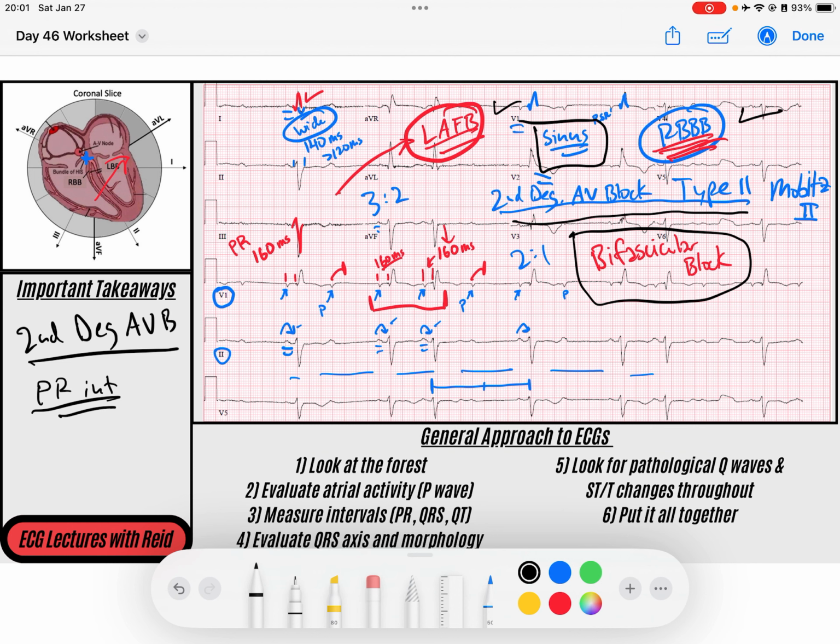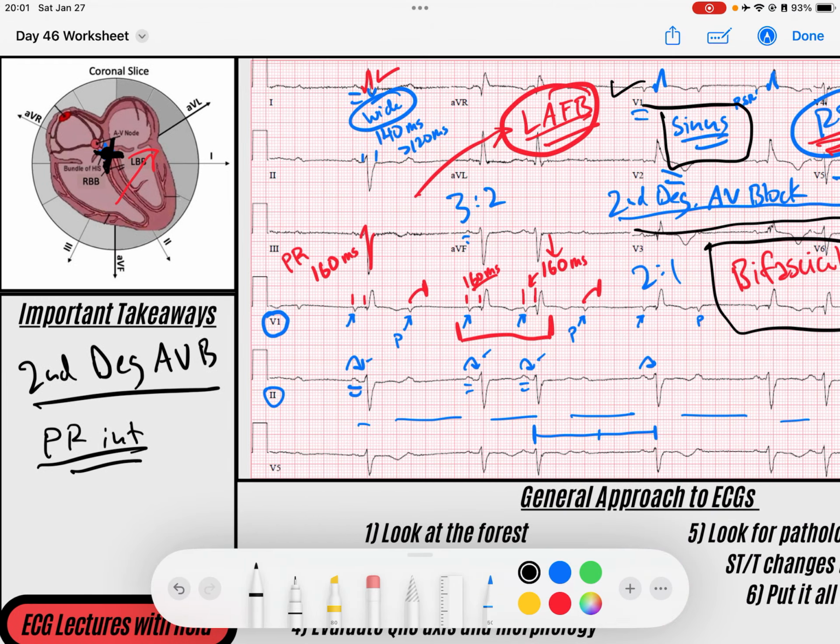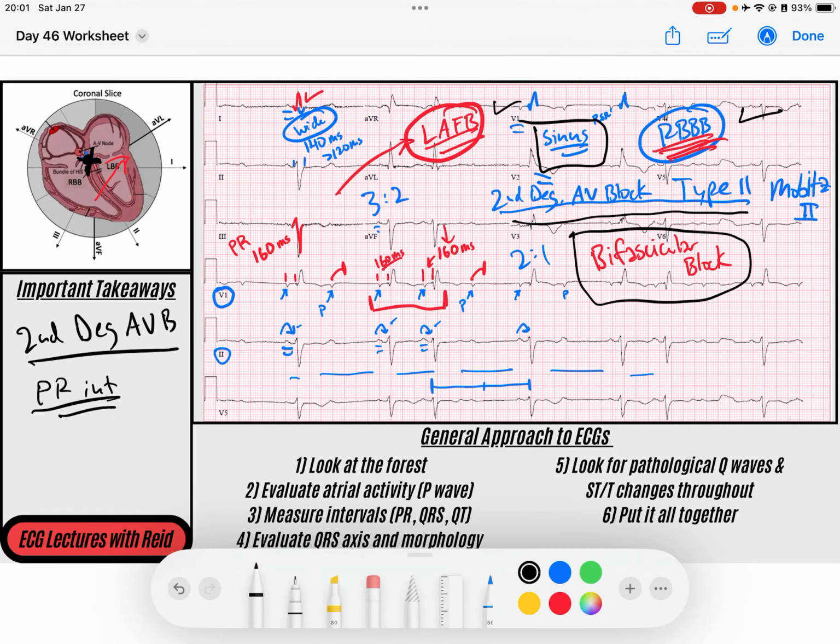There's type 2, this person right here needs an urgent pacemaker because if this block gets worse, because it's in kind of this infrahisian region here, if this block gets worse and completely blocks, they have no ability to create a junctional escape rhythm. And therefore, if it gets worse, all they have left is that ventricular escape rhythm, which is sometimes too slow to keep people alive.